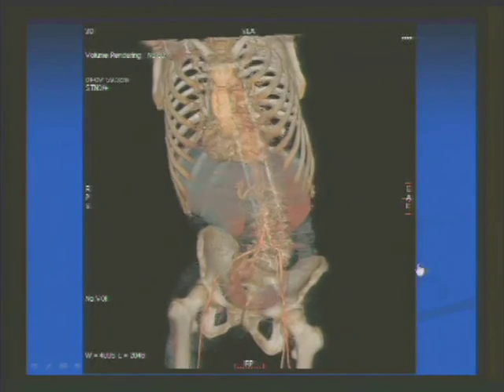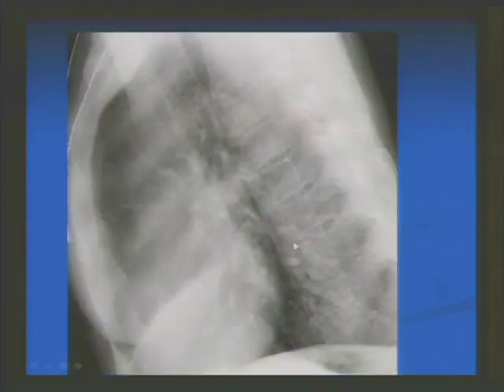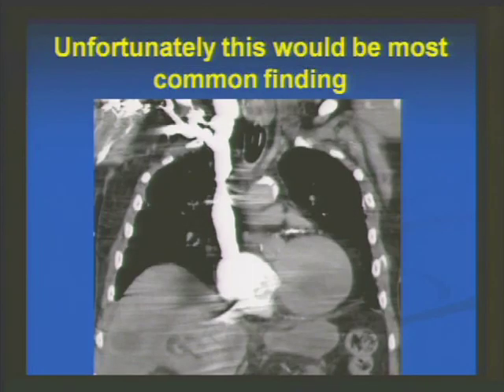Not ideal. But again, the patient was taken to the operating room. As you can notice, all the pedicle screws and the hardware were removed, and a stent graft was placed. And this patient also did very well, never needed a transfusion, and had a prolonged hospital stay because the back still had to be repaired. This is the last thing I'm going to show. Usually it takes a couple seconds before someone chuckles.